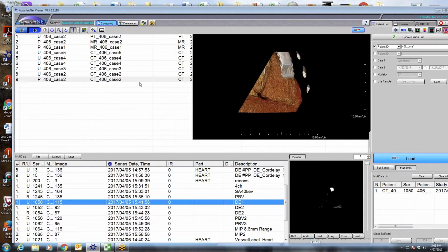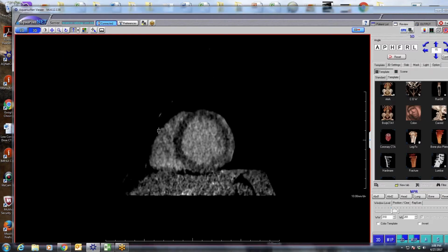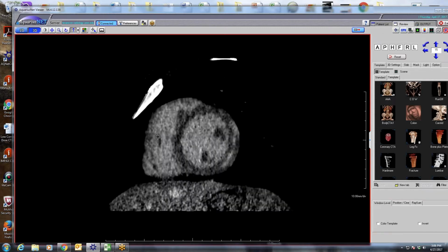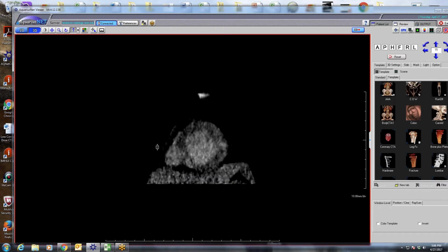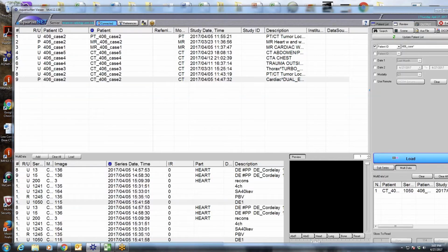So I thought that was pretty amazing. I had never seen a case of myocarditis or any case of delayed enhancement this pronounced. And again, this was a few hours after the MR. So, not that gad would be this bright. But anyways, I thought that was pretty cool.